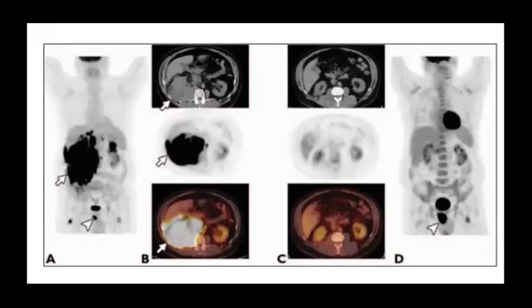And yeah, very nice. After 2 cycles of chemotherapy, this patient responded very well. Okay, so I will check the answers now. Okay, so what is your differential? I see many differentials now, but I am waiting for you to give me one differential.